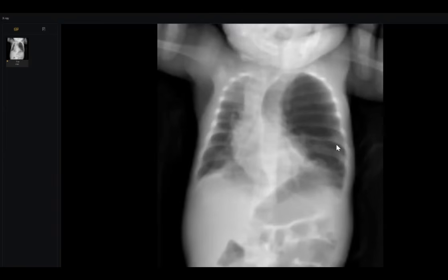This is another piece of evidence. Number 3, why is this not a foreign body? We may include foreign body, by the way, but a foreign body will not go through the trachea and end up in the upper bronchus. That is impossible. Look, if it goes down, it should either close the whole left bronchus or go to the lower bronchus.